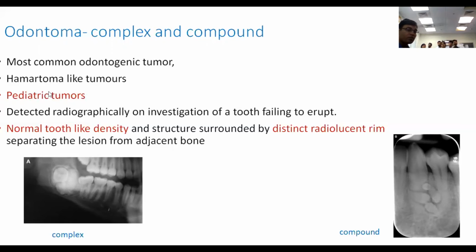The only thing is, this is the tooth that is impacted, and that is the primordial dental tissue. If there are many and it is difficult to differentiate between the tooth and this tissue, it is more likely to be what is called a complex. A compound is usually well-formed teeth. They are rudimentary, but they are well-formed. In this one, it is just crumpled tissue.